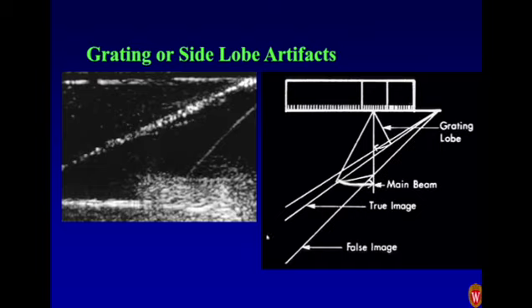All right, there's a block of gel, and I put a needle through the gel, like if you were doing a biopsy. When you guide a biopsy, sometimes you see this thing that you think is a needle, but it really doesn't make sense where it is, and then all of a sudden you pick up, oh, whoa, here's the needle. Well, there's the needle.